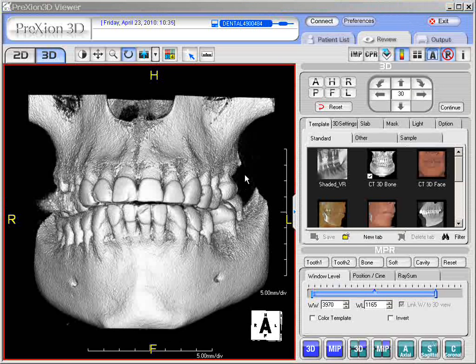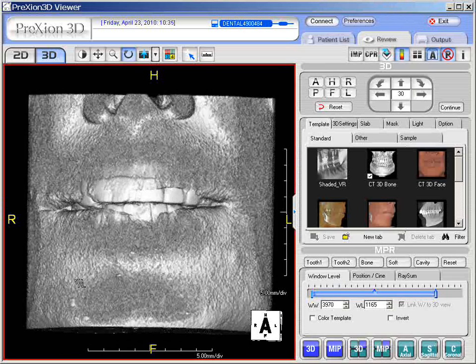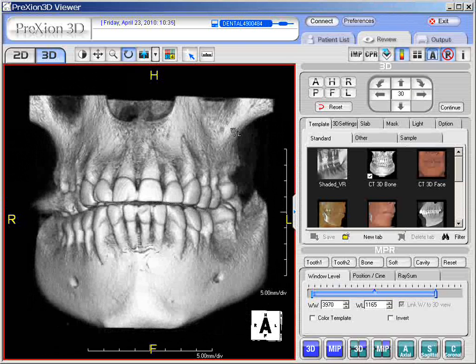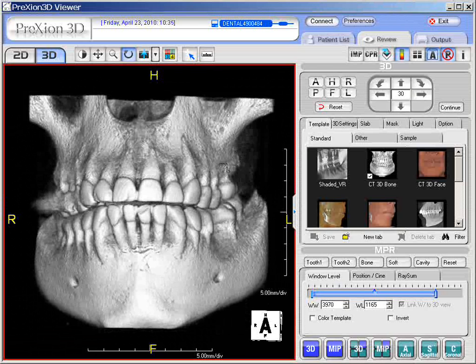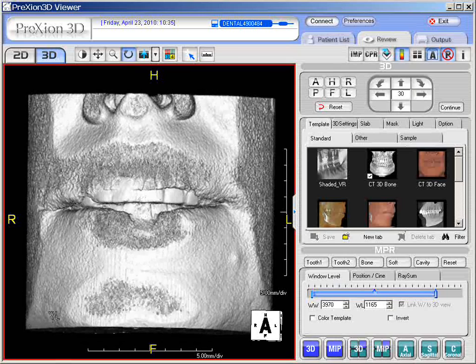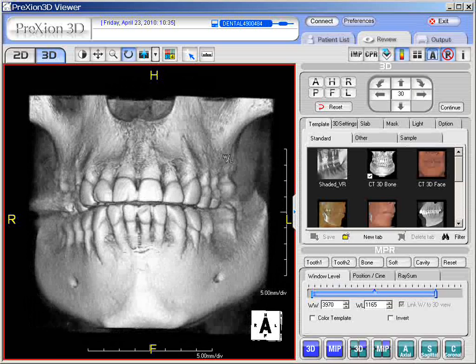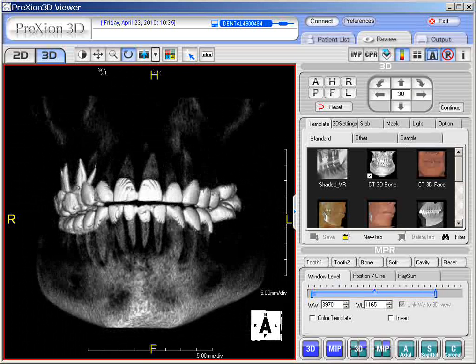Window leveling is an important feature to apply to obtain the threshold between the softer and harder bony elements in the dentition. To achieve this, you hold the right and left click mouse together and move diagonally either to the lower left corner or southwest area for full face template view, or up into the right hand corner or northeast section to have remaining just the bony harder elements.